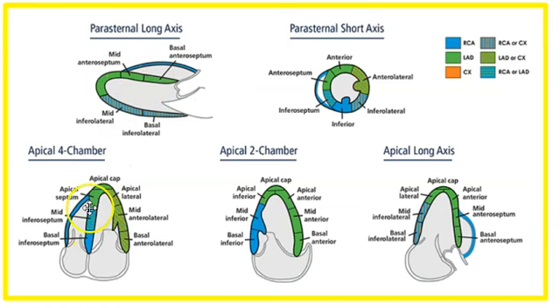And this is perfused by the territories. As we've mentioned before, you can go over here and pick out your territory where the apical cap is going to be LAD, apical septum, primarily LAD. You can see the right side turns blue. It's going to be all RCA here and LAD, and a mixture of LAD and RCA down in this basal septum area here. Okay. Basal anterolateral is going to be all circ or LAD on this side here. Primarily LAD. Okay. But let's go by what they're saying here for technicality purposes.